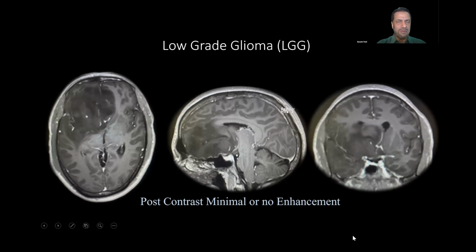Now, another case of low-grade glioma at the base of the skull, which is infiltrating into the temporal lobe and partly into the insula, and then through to the thalamus and also to the opposite side of the ventricle, so the opposite side of the hemisphere through the inferior aspect of the falx. So it is a low-grade glioma. Maybe it is converting into a high-grade glioma because there's a lot of mass effect that you can see here.